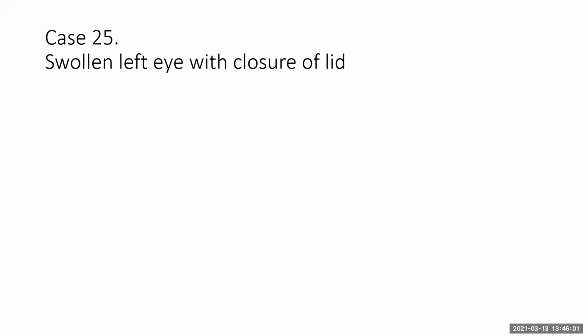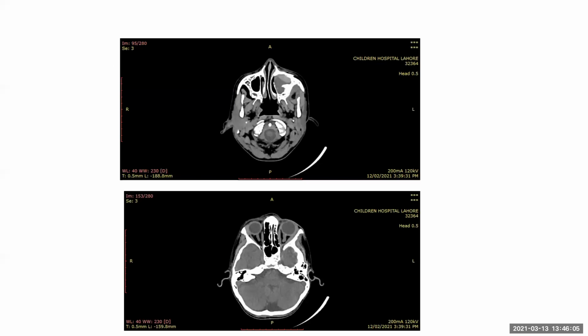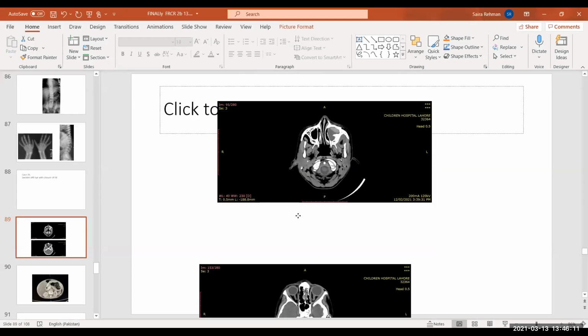So this is another case, of swollen left eye with closure of the lid. Okay, this one I have to scroll. We will scroll through. Sorry.